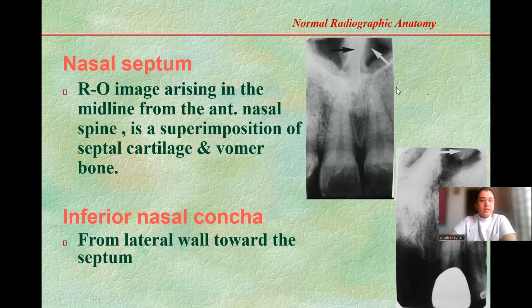Now, what is an incisive canal cyst? I just put it here for just like that. It's an enlargement of the foramen and the canal. If it appears very enlarged, then it's a canal cyst. Not needed for you, but anyways. And what is the shape of this? It is pear shaped. It's not mentioned here. It is an inverted pear shape.